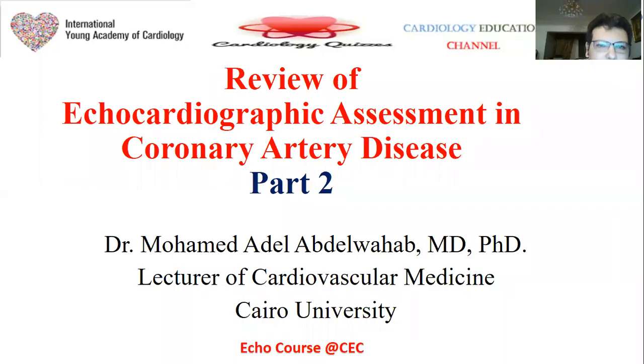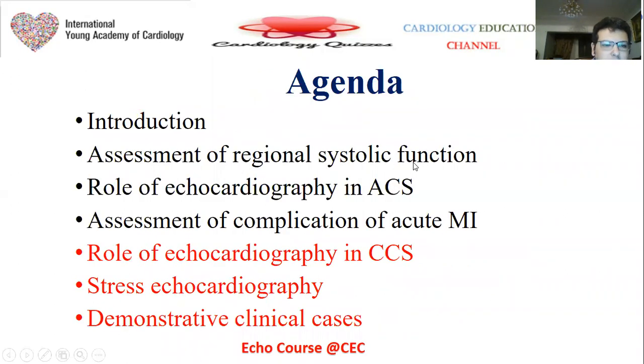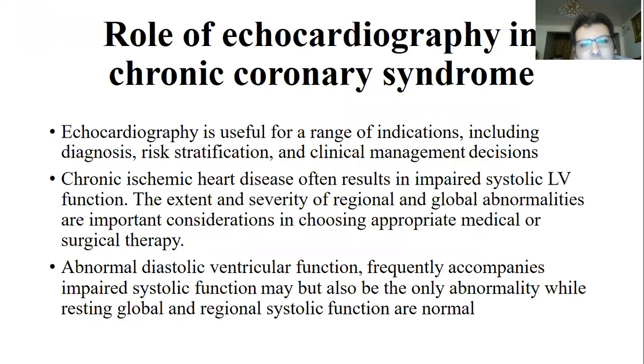Hello, everybody. This is part 2 of our lecture about echocardiographic assessment in coronary artery disease. We will talk about the role of echocardiography in chronic coronary syndrome and stress echocardiography with multiple demonstrative clinical cases. Echocardiography is useful for a range of indications, including diagnosis, risk stratification, and clinical management decisions.